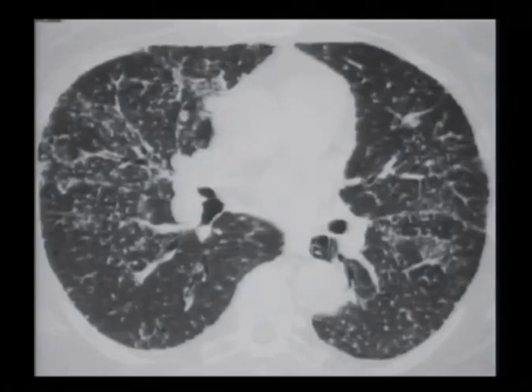We want to differentiate perilymphatic and random. Random is usually widely disseminated, upper, mid, and lower lungs affected, anterior, posterior, middle, inner, outer third, all relatively similarly affected. Perilymphatic processes are patchy. Some areas are abnormal, other areas not so abnormal. This is a fairly patchy process. Less abnormal here, more abnormal there. That usually puts you in that area of sarcoidosis.